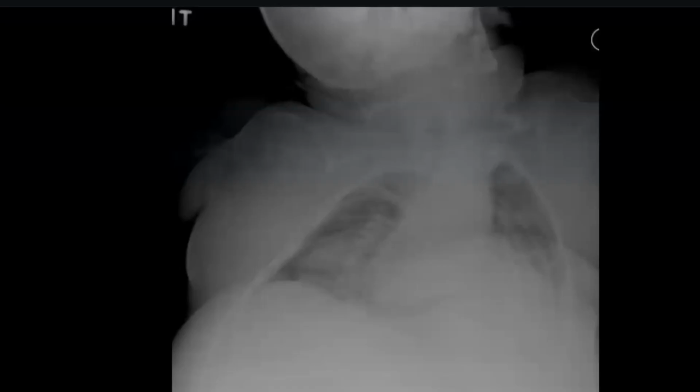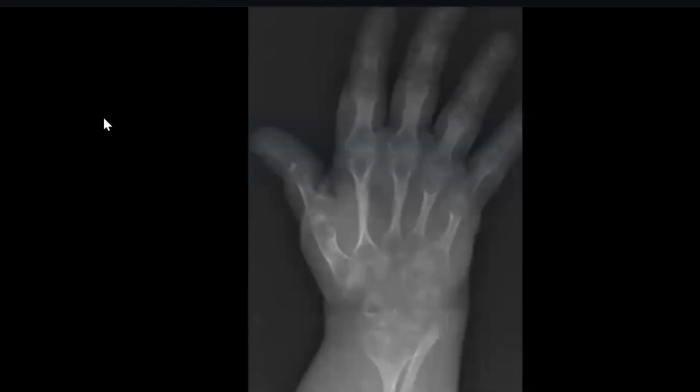Can I look at the joints once again? At the hand and the knee joint. Yes, in the hand, I can see that there is bulbous expansion of the distal radius, and also there is positive ulnar variance. The ulna is more forward, and there is decreased bone density of all the carpal bones with loss of the joint space.